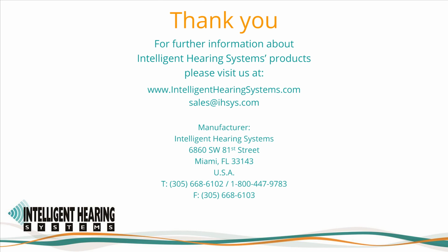This completes the review of the SmartEP Cortical Evoked Potentials options.